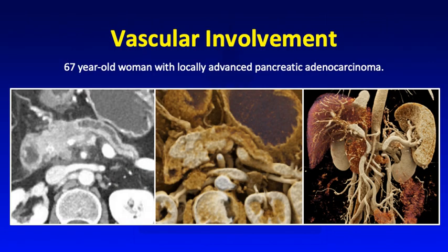And just some still examples. So this is another patient with locally advanced pancreatic adenocarcinoma, and we can see this subtle hypoenhancing mass in the body. And again, on the vascular maps, we can really see how this mass is totally encasing and narrowing the portal SMV confluence.